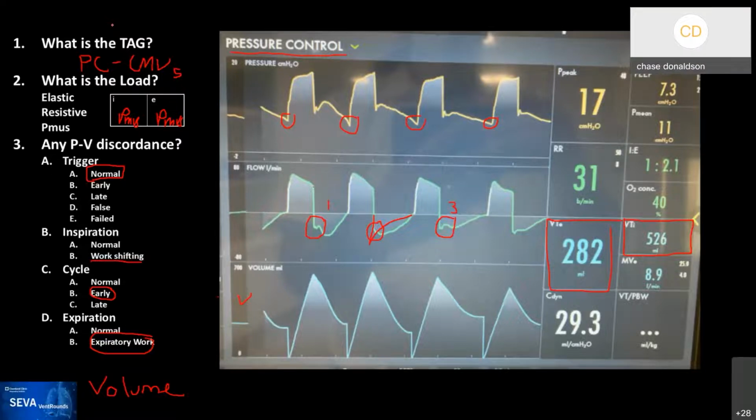The question is, can you know what is actually the ventilatory tidal volume, like what is actually expanding functional lung and participating in gas exchange? I'm not sure you can really tell, and you kind of would be guessing depending on where the leak is, wouldn't you? Yeah, thank you, Chase. Rob, what do you think here?